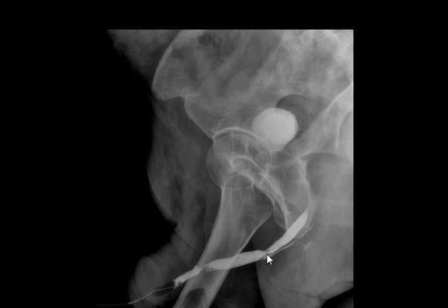This is contrast tracking outside the urethral lumen, okay? Suggesting either leak or some kind of fistula or sinus tract. And of course, in this case, with multifocal narrowings and contrast leak, the number one differential is what, Rehan? It's Littre's or Cooper's gland.